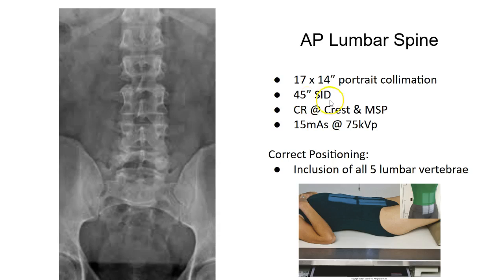You are going to use 45 inches SID in our lab. Remember, out at clinicals, you may be using 40. And you are going to center, or our textbook recommends you center, at crest and mid-sagittal plane. But let's talk about that for a second. Do you remember which vertebral level iliac crest corresponds to? Well, if you said L4 or L5, you're correct. So we have 5 lumbar vertebrae, right? So I would suggest you center closer to L3, which is the middle of the L spine. Our textbook suggests you center closer to the bottom.